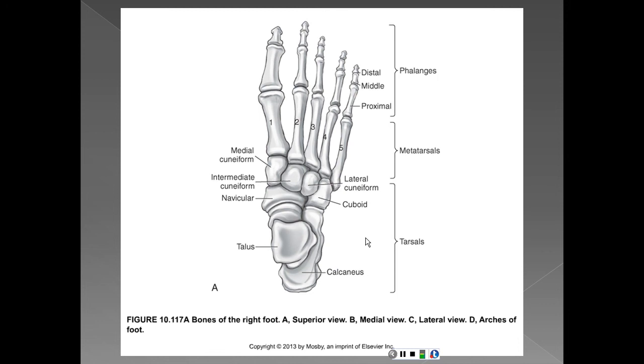So here are the bones of the right foot, superior view. And here are the phalanges that stop right up in there. Then you have your metatarsals, and then you have your tarsal bones.